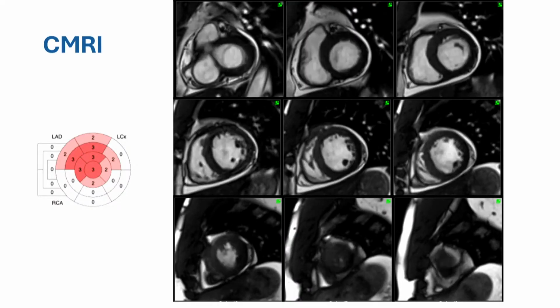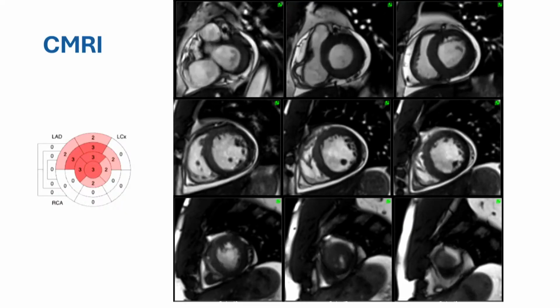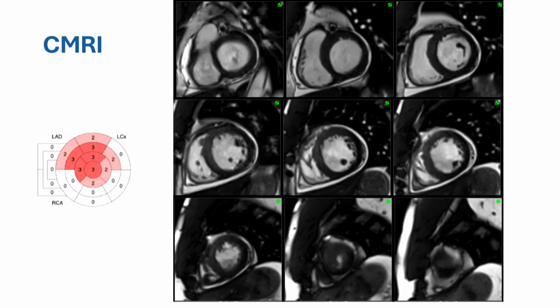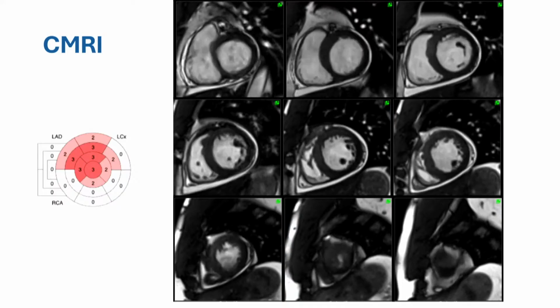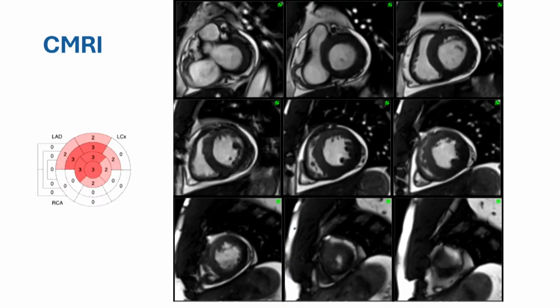Quick question for you. What is that bright area around the myocardium? Go nice and slow. Tell us what it is. It looks like pericardial effusion. Okay, so we can see a small circumferential pericardial effusion. This information we knew from the echo: we knew about the EF and the wall motion abnormalities. Again, the question for us was LV thrombus.